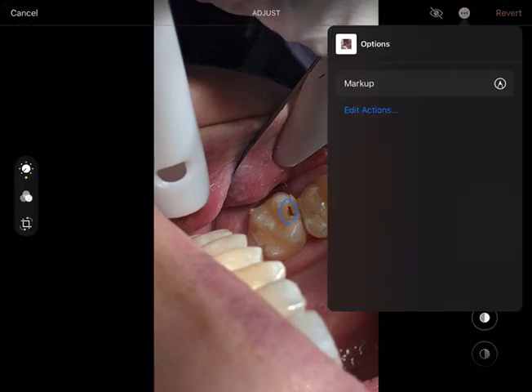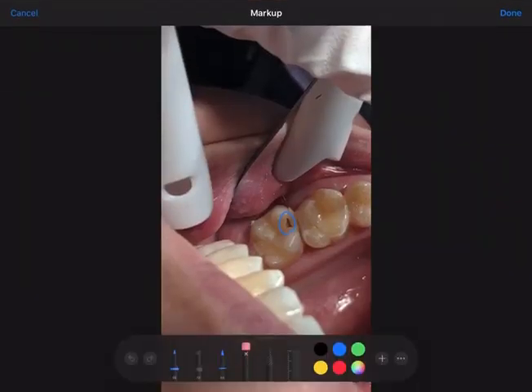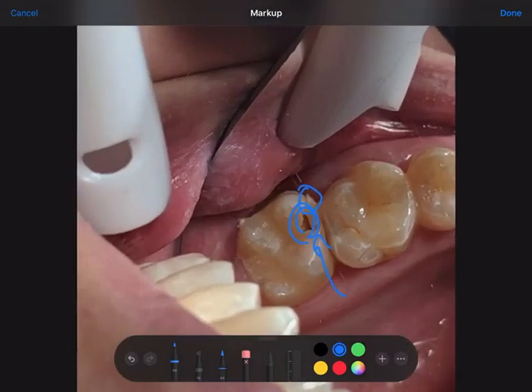where we're starting to see a little bit of a cavity starting here, and the main complaint that the patient had was that they were getting food stuck and they were starting to get a little bit of discomfort and pain from it as well. A little bit of cold sensitivity too. And it makes sense why when we look at this photo, because we're starting to see a little bit of a hole right inside the tooth. And it's to the point where a small portion has started to fracture there as well.